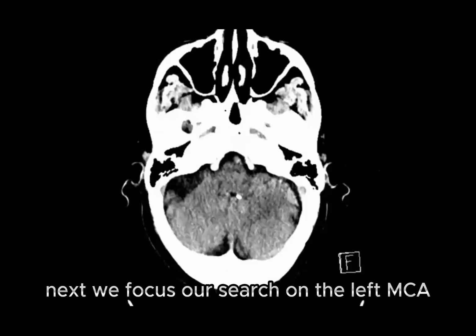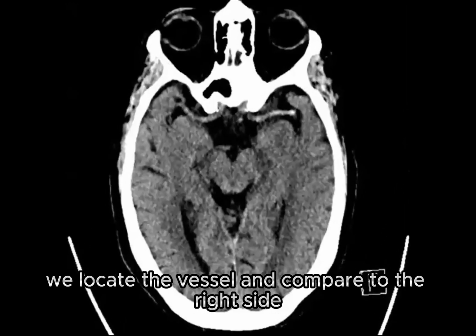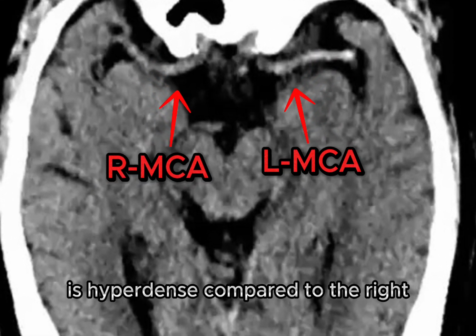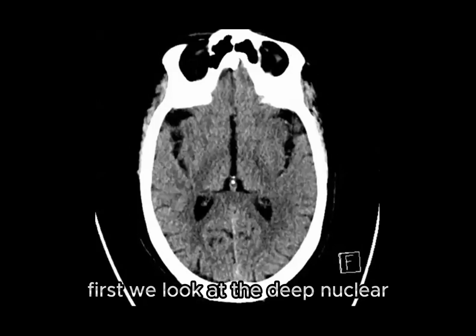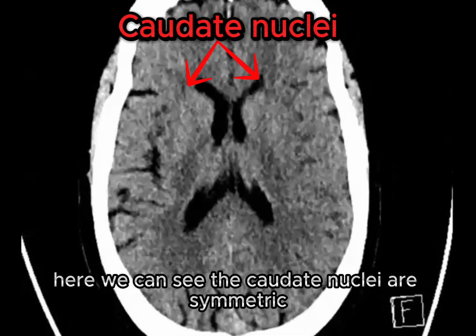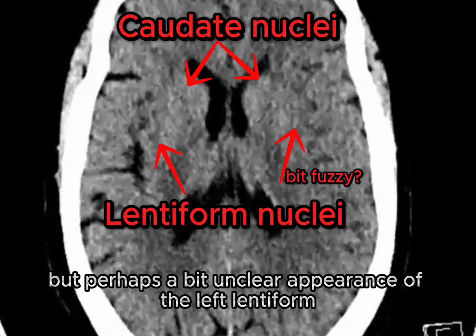Next, we focus our search on the left MCA. We locate the vessel and compare to the right side. Here we can see that the left MCA is hyperdense compared to the right, consistent with an acute embolus. Next, we focus our search for any signs of ischemic changes. First, we look at the deep nuclei. Here we can see the caudate nuclei are symmetric, but perhaps a bit unclear appearance of the left lentiform nucleus.